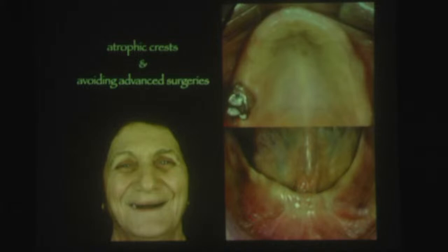So you see here, there is a very, very big bone deficit, bone loss. And the patient went to a dentist, another dentist, another; no, we cannot do it, no, we cannot do it. And when she came to me, yes, I thought I cannot do it, but let's evaluate the radiologic X-ray data. So, the patient has one tooth, number 16, okay? And it doesn't have any strategic importance for us. But what did we do?